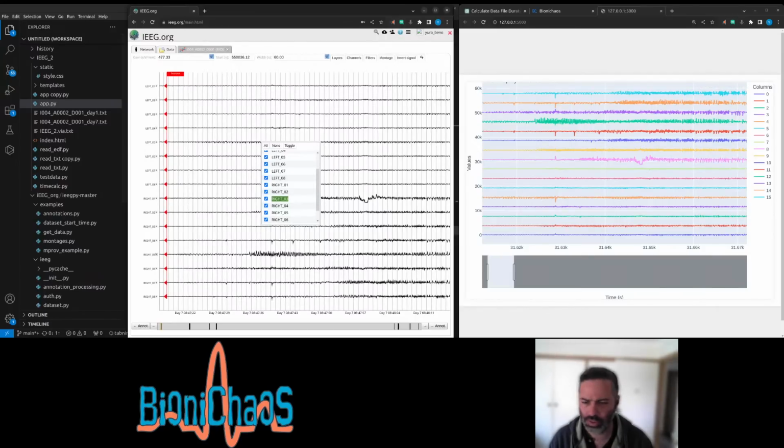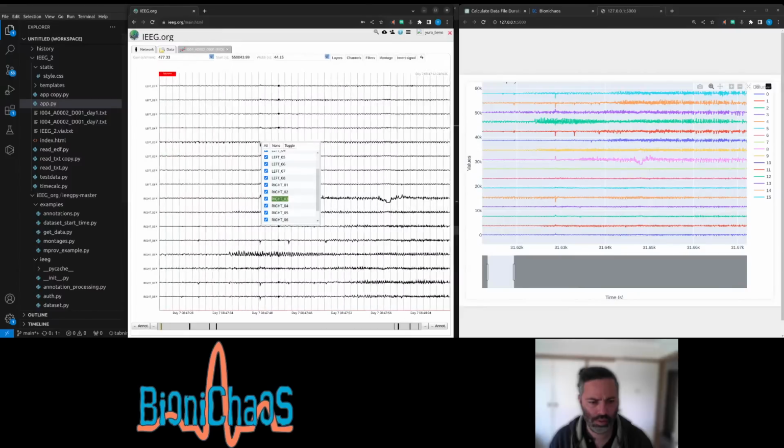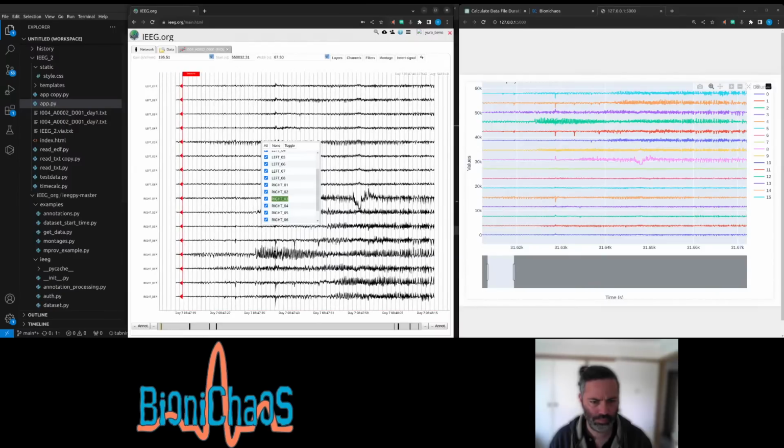We have right of 5. Right of 5 must be, can't really tell. Right of 5. There's something. Say right of 8.